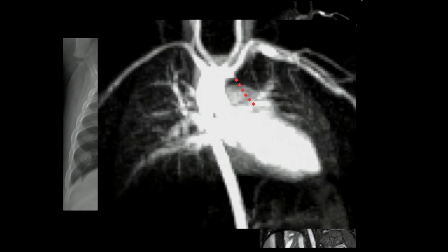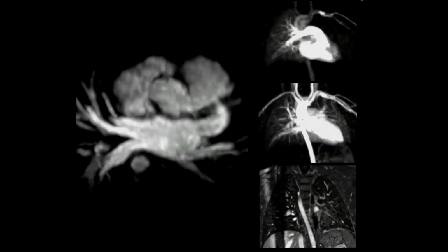Okay? So in that, usually the disconnected pulmonary artery is on the opposite side of the aortic arch, almost always. Therefore, having that plain film is very, very suggestive of this diagnosis. And the pulmonary vein on that side is very, very tiny here.